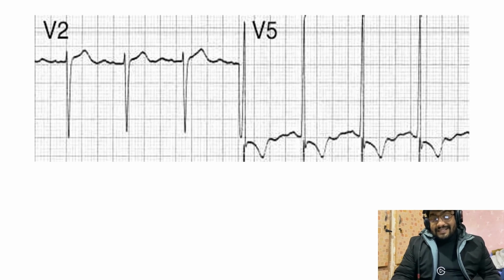So we discussed that the R wave in V5 or V6 shows the left ventricular mass, right? So if we look at R wave, it's quite huge. If we start counting from here, one large block, two, three, 4, 5, and 6. So individually, R wave in V5 is fulfilling the criteria of left ventricular hypertrophy. So this patient has left ventricular hypertrophy, but there is something amazing that I would like you to look at.